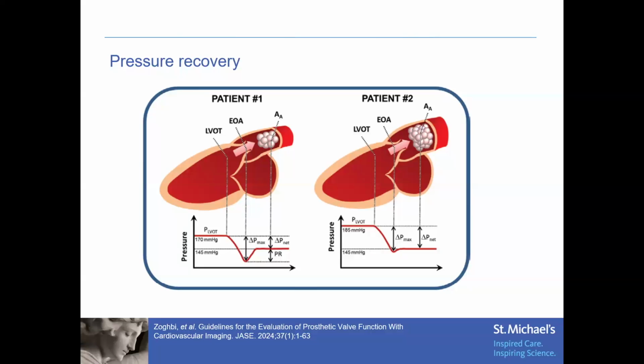So why does this discrepancy matter? Well, when we think about what the patient's heart is hemodynamically doing, we're really looking at assessing the LVOT gradient in relation to the ascending aortic gradient. That gradient is what we find the gold standard is hemodynamic catheter assessment. So we just need to be aware of times where our echo assessments fall apart a little bit, and when we're a little bit underestimating or overestimating the gradient. And so pressure recovery is just something to keep in mind.